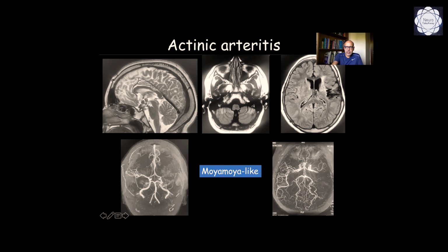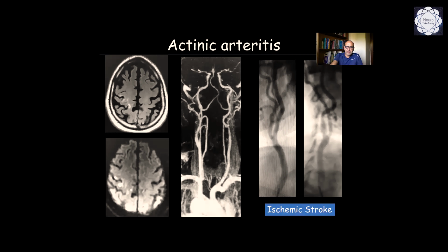But we found this, which was kind of surprising for us, in the middle cerebral artery territory, and on MRA we found this arteritis at the level of the middle cerebral artery. This complication is rare, but it can occur, and it can have a moyamoya-like pattern on some occasions.